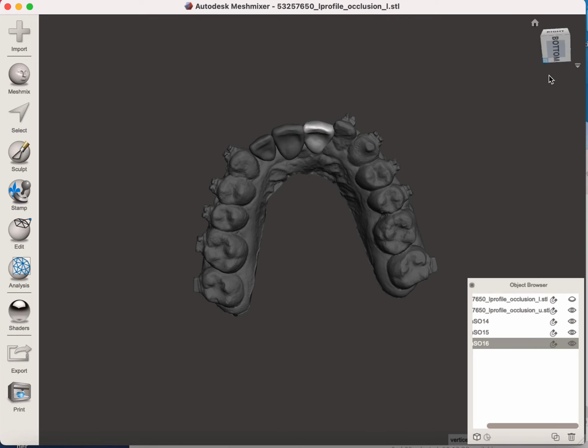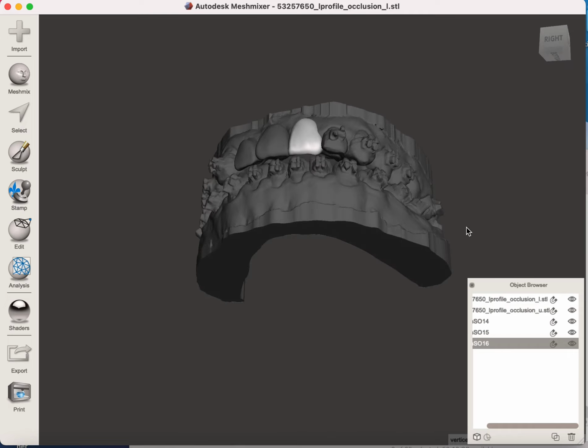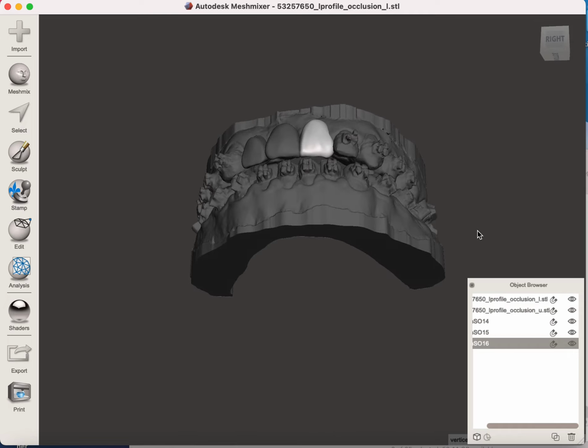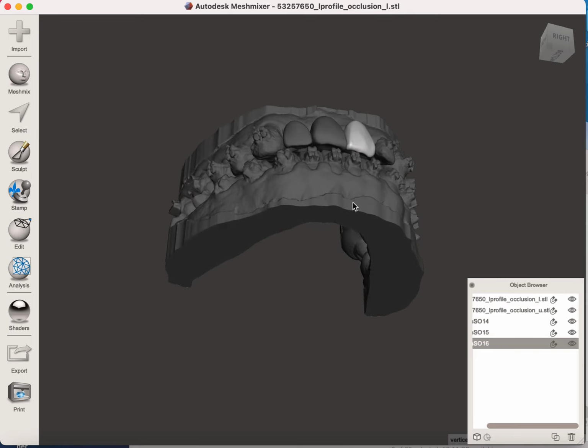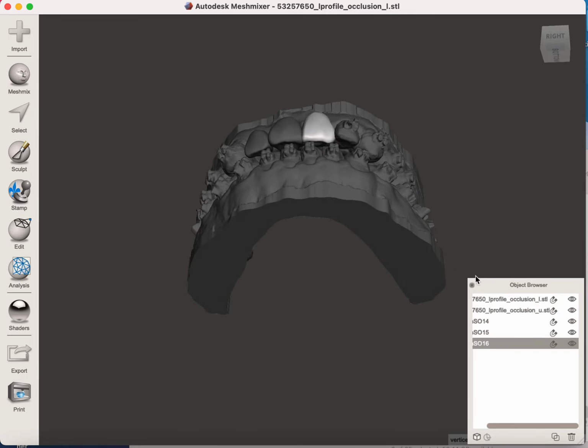Okay, so once I select all that, what I do then is go back and show the lower arch. And so then you can really see, do you have adequate overjet? And you can see I've made more than plenty overjet for this. In fact, I can probably afford to go back a little bit. Okay, I didn't finish this case right, so I'm going to have to use uLab to push the upper left 2 a little bit more lingual to get better alignment.